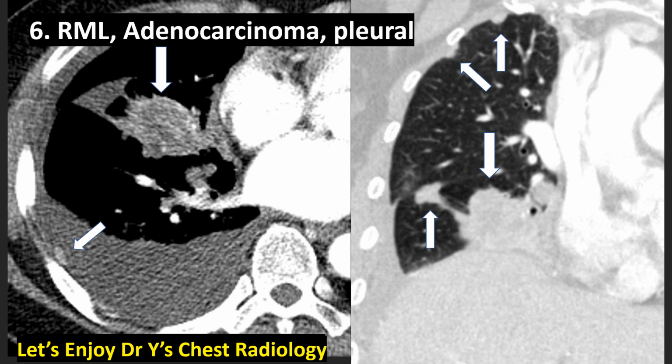Now these CAT scan images show us where the tumor is and what happened to the right lung field. The mass is in the right middle lobe, 4.5 cm in length, and smaller arrows indicate pleural nodules, pleural metastasis, and malignant right pleural effusion. The coronal lung window setting image shows us a right middle lobe mass with pleural invasion, and pleural nodularities confirming pleural metastasis.